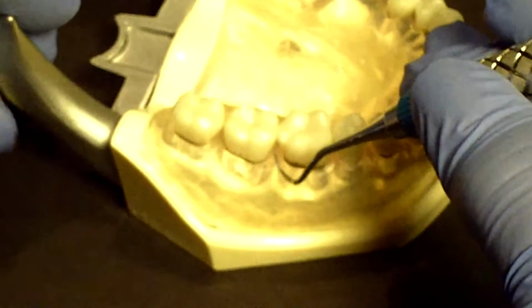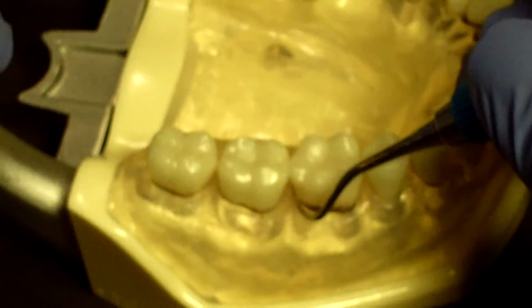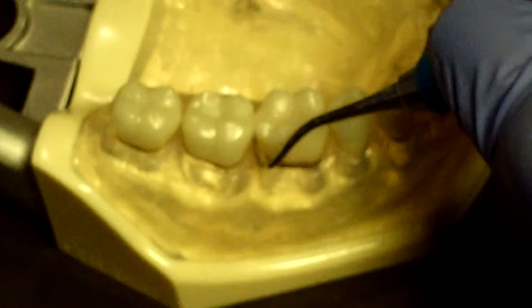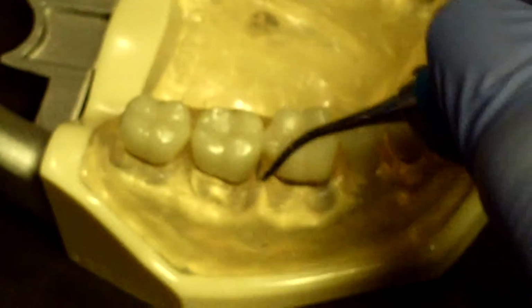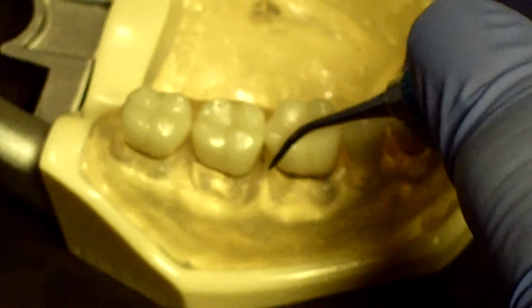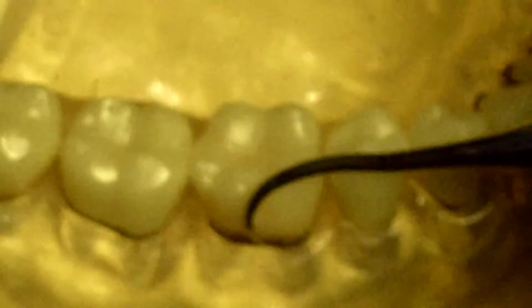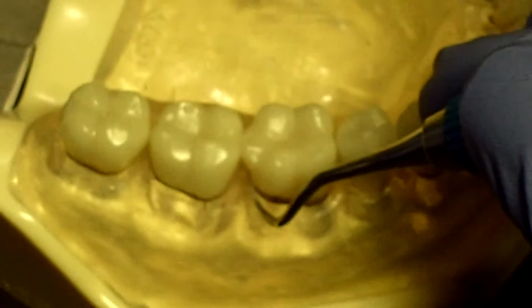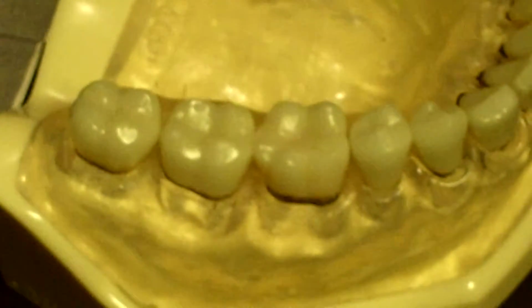This time we're going in a toe-up fashion, and we know that the Nevi is a sickle, and it's meant to go under the contact like so, on the distal of tooth number 30, and here the mesial of tooth number 31. We're not going to use this in a probe fashion, because we do not do that with a sickle. It's meant to be supra. Our curved inserts can do the same thing.